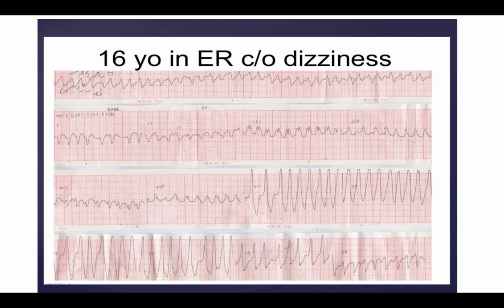No worries. Okay, so I think the first thing I noticed was that we have a fast and wide rhythm. Uh-huh. So the first thing that I'm worried about is a ventricular tachycardia. Okay. Is it irregular or regular?